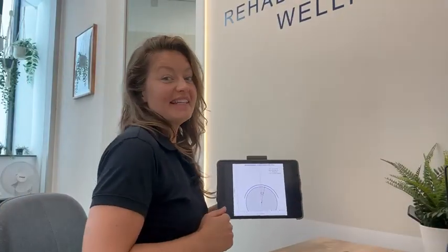So the last of the X-rays that we're going to talk about today is the anterior center edge angle. Okay, so this one is taken from a false profile. So where the others have been taken front to back, this one we're going to come from the side angle. Instead of it being a lateral, which is out to the side stability from this way, we're looking at the amount of coverage that you have forwards and backwards now for this one.